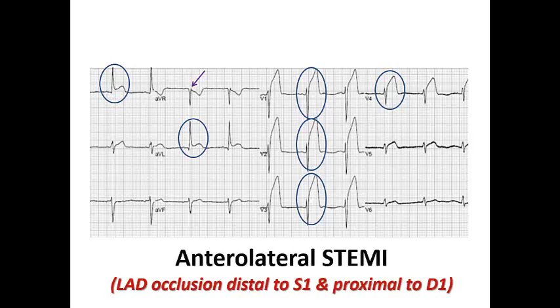So here it is a case of anterolateral STEMI as the patient here is having LAD occlusion distal to S1 and proximal to diagonal 1. So the anterior leads are involved from V1 to V4 and also in 1 and AVL. So it is anterolateral STEMI.